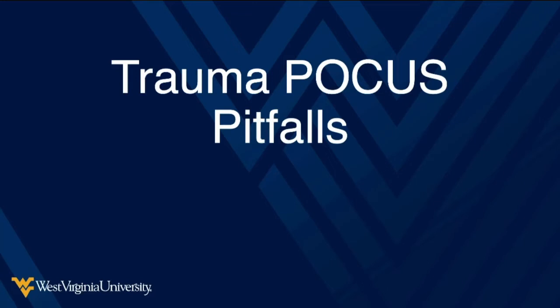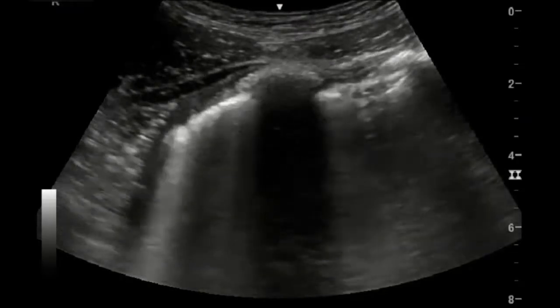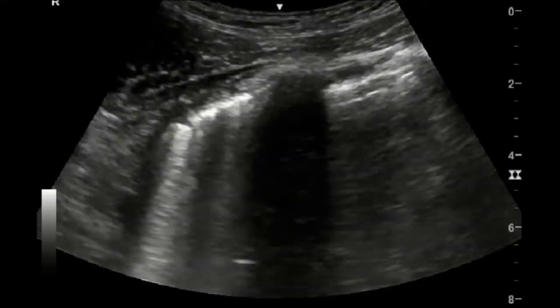Let's lastly just look at a few pitfalls and some areas where you may make mistakes. And hopefully you can avoid these mistakes by recognizing them and what they look like. The first one, we alluded to this earlier. We talked about what lung point looks like and what lung point means.